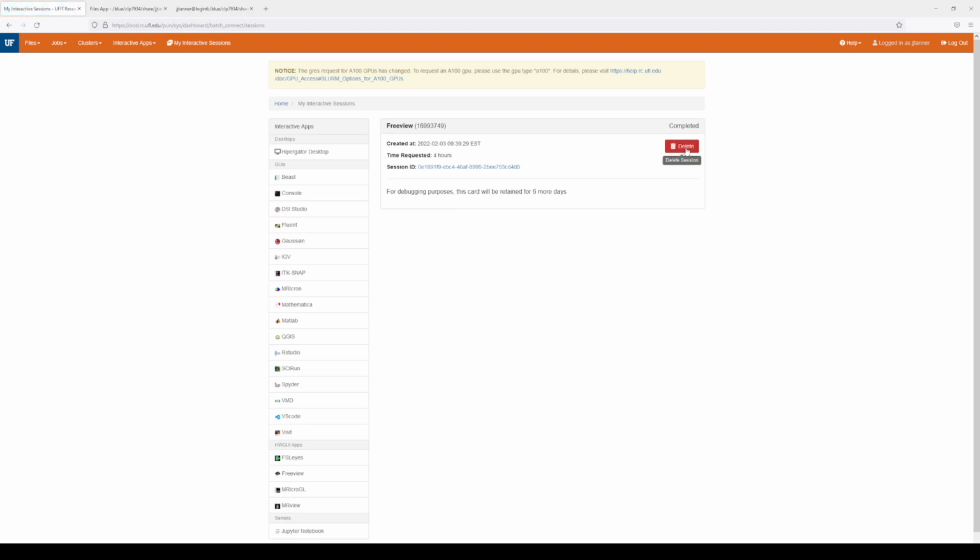All right, it's done. This is just for debugging if there are issues. So if you had some problems, you could contact the HiPerGator IT team. But because I quit FreeView, meaning I clicked on the X, then it actually ended this session. So that's gone. Let's come back here.